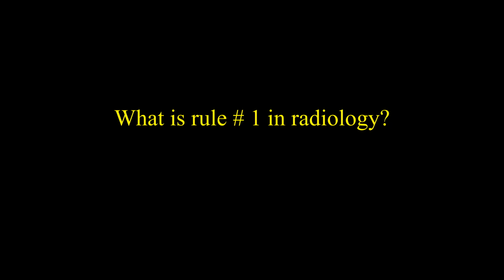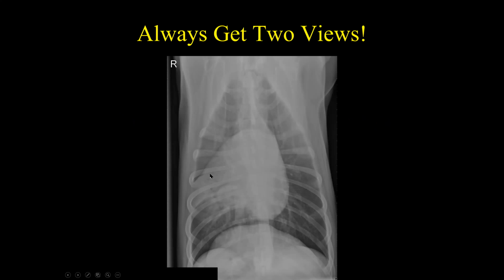So, and then we just said that the most common spot for alveolar infiltrate from aspiration pneumonia is the right middle lung lobe. So what view do you think would be best on a lateral view, the right lateral or the left lateral view, to see abnormalities in the right middle lung lobe? Left. Yeah, it would be a left lateral view. So it's the opposite of kind of what you would think.